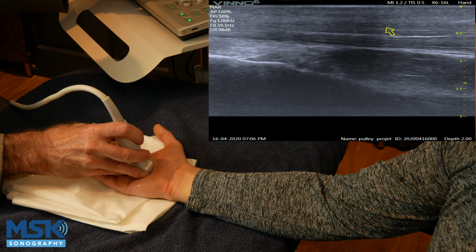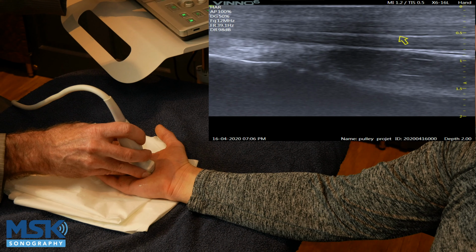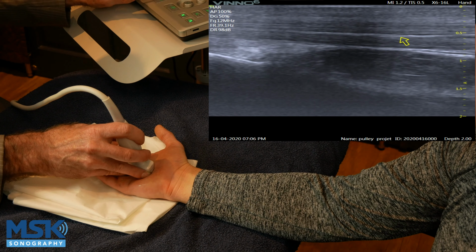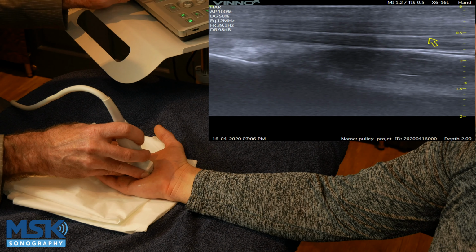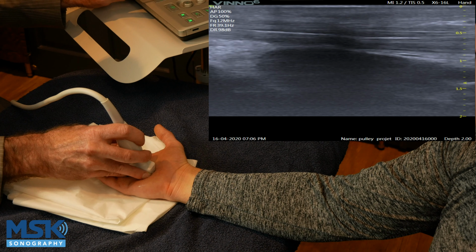The literature doesn't have any mentions at all about flexor tendon injuries in this part of the hand. In our case study though, we'll see a massive tear in the actual flexor tendon of the FDP in about this area through here.